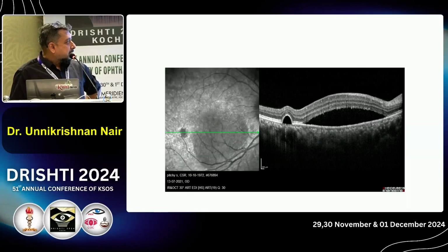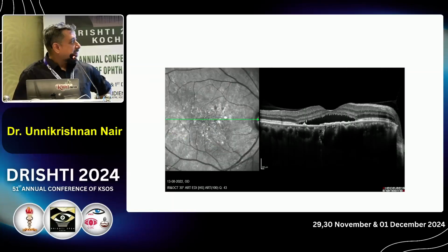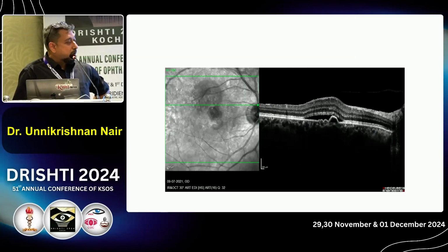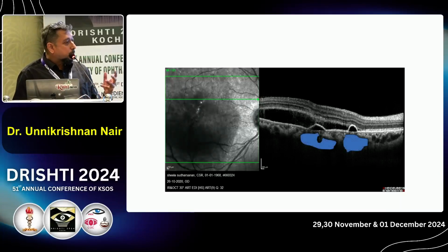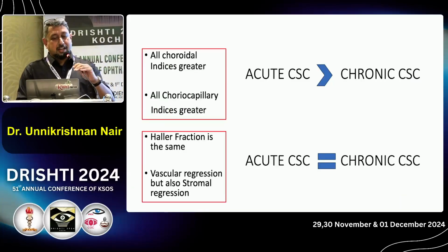choroidal damage. You see a single, larger PED, and the focal or vertical choroidal damage is more evident here. Here you see a larger involvement of the RPE, and you see a large, multi-septate choroidal anomaly. Again, a multiple PED here, and you see a larger choroidal abnormality over here. Here you see a single PED with a single larger lesion, and a broader lesion whenever the choroidal or the RPE damage is over a larger area.